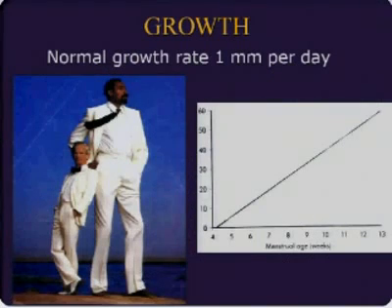Growth is unbelievably symmetric in the first trimester. There is no diversity. So it doesn't matter if you're going to be Wilt Chamberlain or Willie Shoemaker and be a basketball center or a jockey. When Wilt and Willie were both 6-week embryos, they both measured 1 centimeter. There is no biologic variation manifested in the first trimester. And we can use this to our advantage.